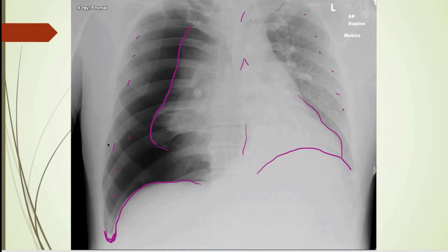And all this pressure is what's making this left lung small as well, lowering the volume. There's just so much pressure you just can't get it inflated very much. I would imagine this patient's probably hypotensive and so forth. It's really profound when a patient has a tension pneumo or develops a tension pneumothorax in front of you. It's just incredible how hypotensive they get and how it almost immediately corrects itself once you release that pressure.